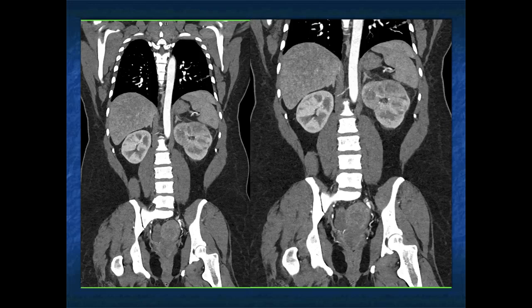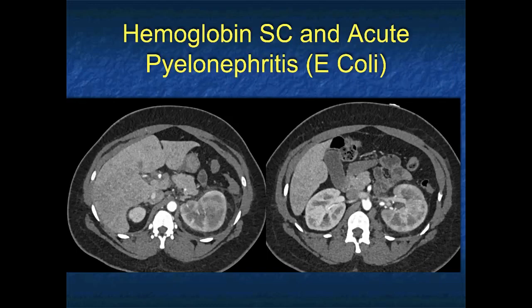Perfusion changes, typically infection, infarction. In the younger patients, it can be due to tumor, it can be due to many things, but in a large kidney, patchy decreased attenuation, stranding around the kidney, the best diagnosis is pyelonephritis. And that's precisely what this was.